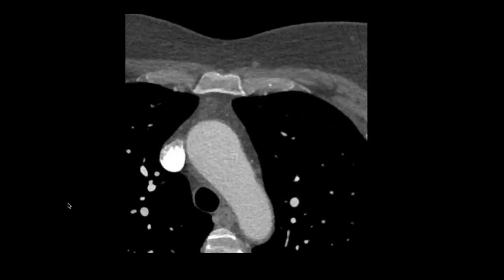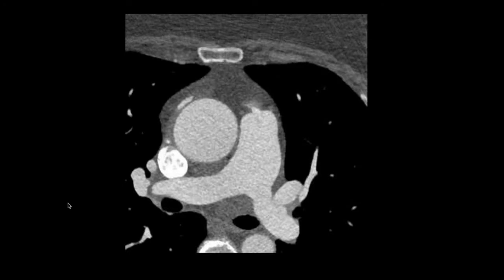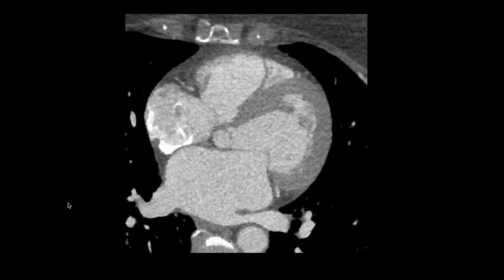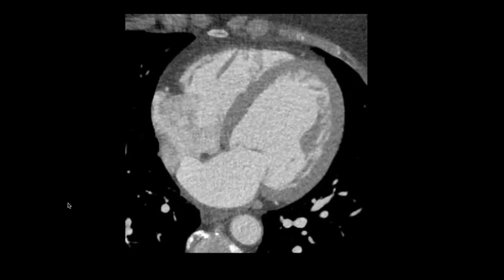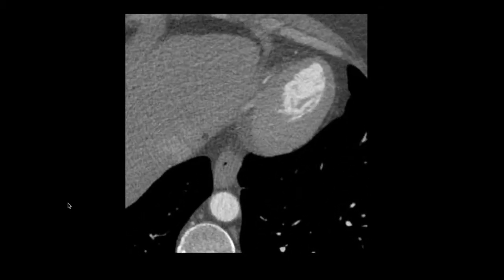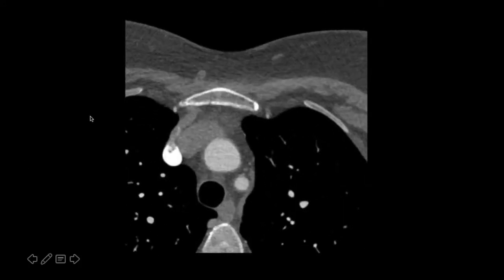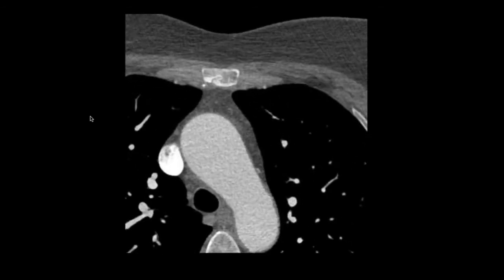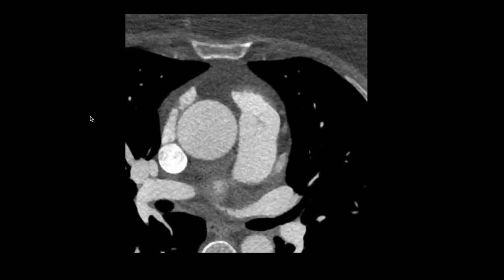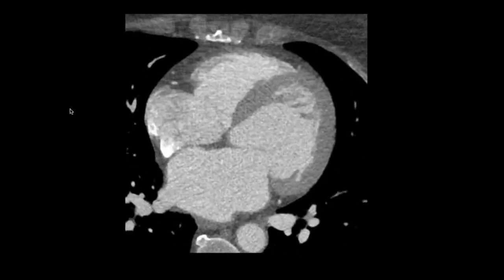I'll just scroll through it one more time. See if you pick up anything else that might be of interest. The left atrium is a bit large and the left ventricle, she may have an interatrial septal aneurysm. Is there a little vessel anterior to the aorta, like an arteriovenous? It's just not enhancing much. Right there, over the pulmonary artery. That's just a vein. It's just a venous variant. Okay. I think it's just a little vessel, yeah. It's a venous variant, yeah.